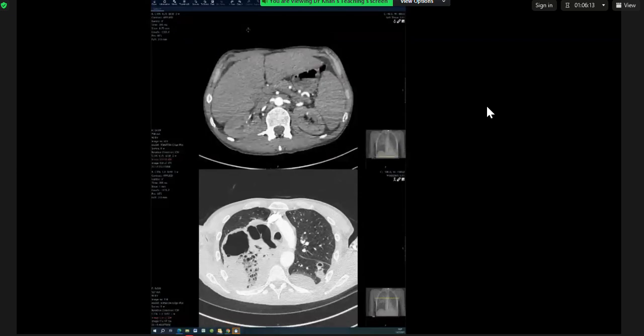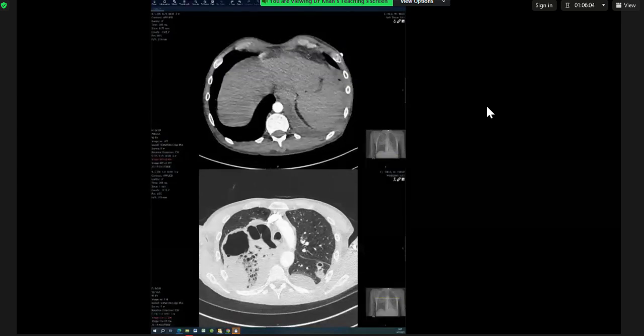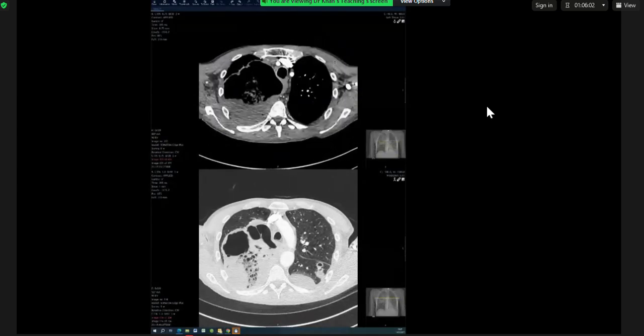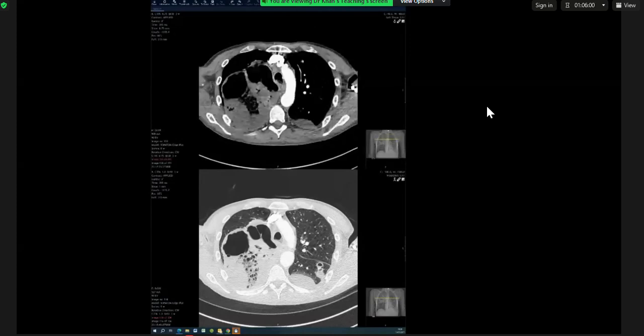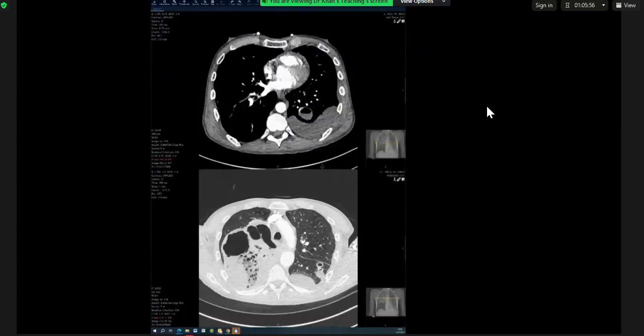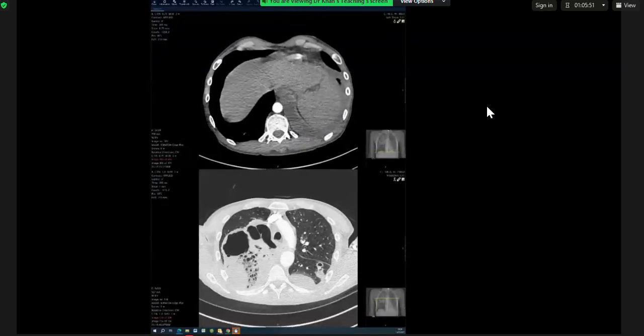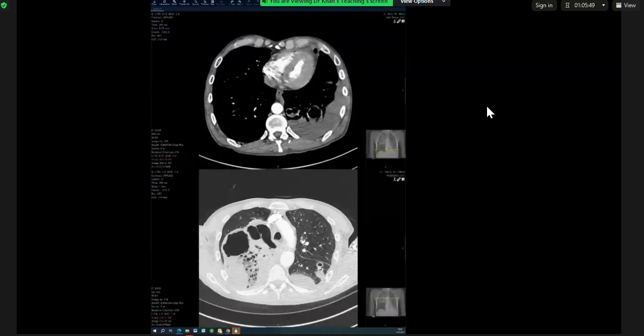This can be pleural effusion. This is away from the spleen and the kidney. So this one is pleural effusion. I just want to detect if there is a split pleura sign or not. In my opinion, it doesn't pick up so much of a split pleura sign.